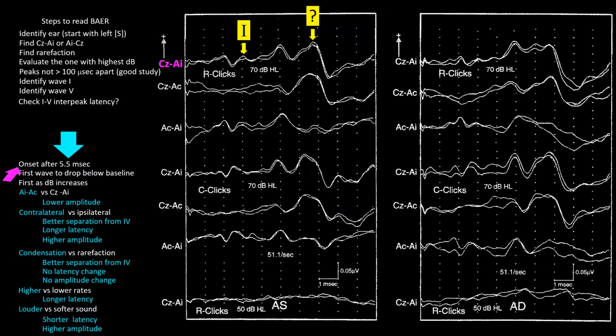The first item is if it is present after 5.5 milliseconds. This is clearly so. So this item is met. Next item is the one we use to choose the putative wave 5. So it is certainly met. The wave thus crosses the midline. Therefore, this item is met.